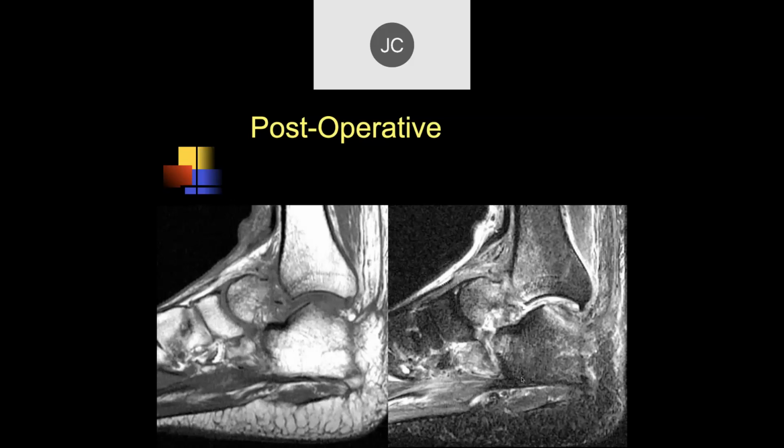Okay. John, do you want to comment about this? That's been a procedure that was used. I don't know if you're going to get to talar fractures, but I'm sure you will. It's not unusual to get avascular necrosis of the talus with fractures of the talus. But I don't know what they did here.